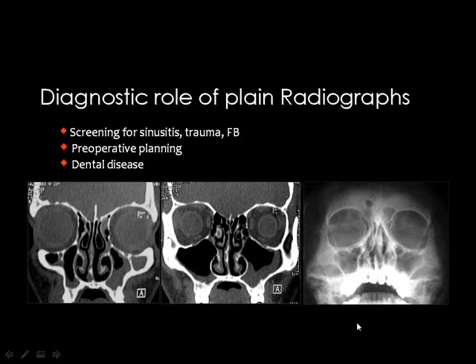But in order to be sure about the sinus disease, we should have this routine study, which is performed in the coronal scans, and we are sure that the sinus is containing some of these secretions.